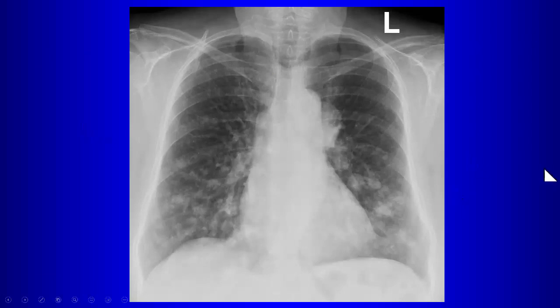Lymphadenopathy. What else do we see on this patient? Masses all over. Bilateral lung nodules. What do we think is going on with this patient? Lung cancer with mets. So metastatic disease, right?